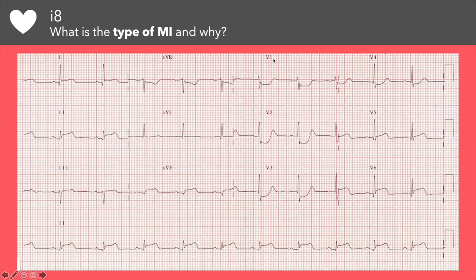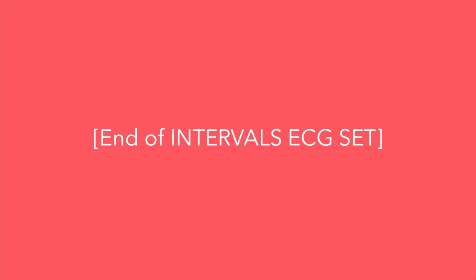Note that in the anterior leads here, there is ST depression. When you see ST depression in the anterior leads, that could mean a posterior STEMI. A 15-lead ECG can help determine whether there is a posterior STEMI or not. These R waves in the anterior leads may actually suggest a Q wave on the posterior side.